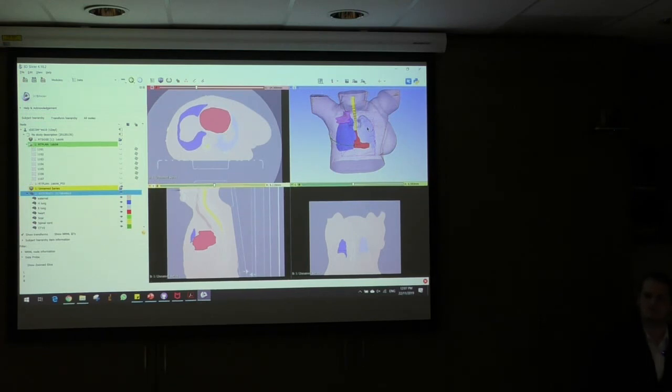Because this one is a bit tricky. What images I have, that's JPEG images actually. This one is very nice, like different intensity of images, bones look different and then the soft tissue looks different. What images I have, that's a very complex image because that's actually inside the breast. So a few images are very dark and a few are good intensity. So I'm finding it pretty hard to distinguish in both. Have you tried using the threshold effect? You have? Yeah.